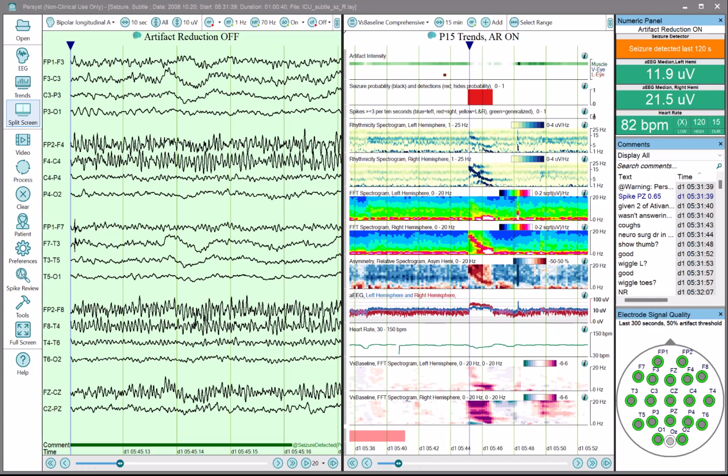Hello. In this screencast, I'm going to go through, on the fly, some ways of getting FFT measures out of Persyst into CSV values. And there are multiple ways to do that. I'm just going to do this stream of consciousness.